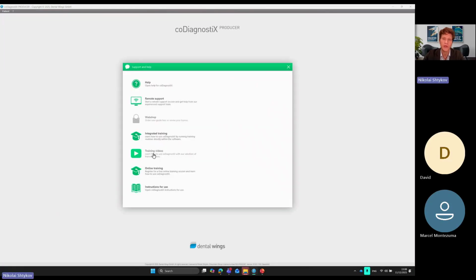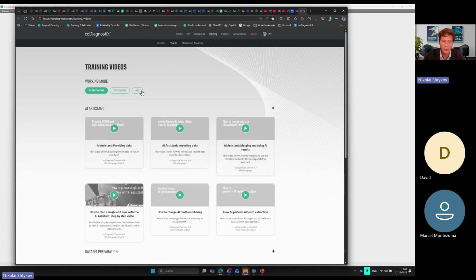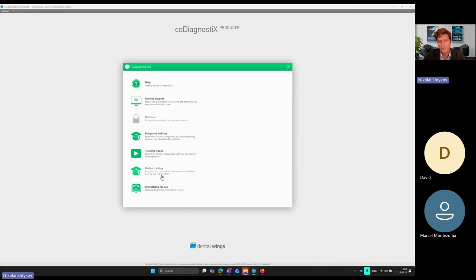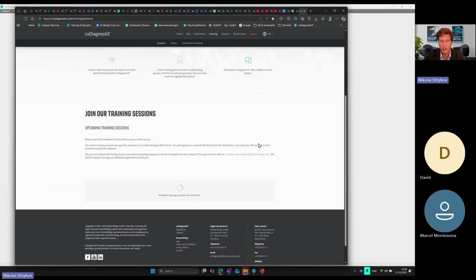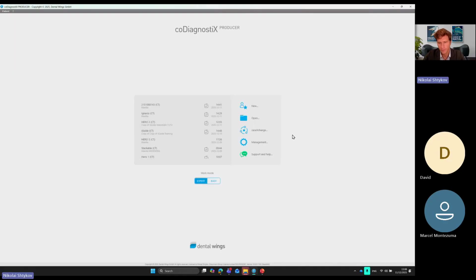If you click on training videos, it is very helpful. When you go here, you can see training videos and step-by-step guides on how to use coDiagnostiX. If you go to online trainings, this is the same coDiagnostiX web page where you can see our live webinars, and you are in one of them. And of course, you can find here instructions on how to use coDiagnostiX.